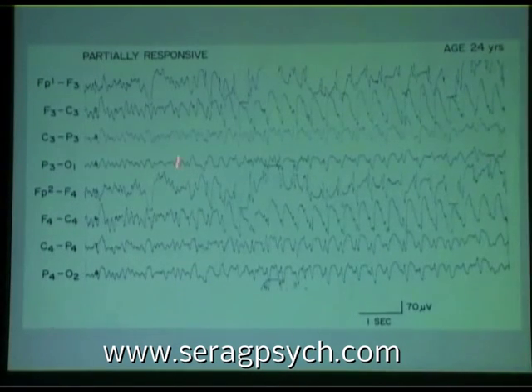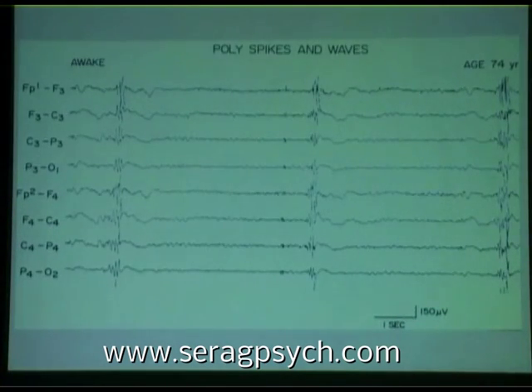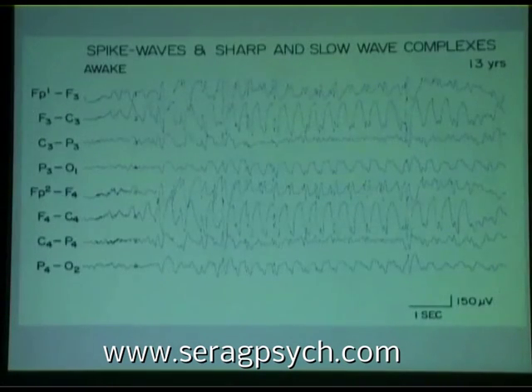And then as she gets a little bit more alert, she goes into spike wave discharges. So next, please. And well, I guess these are still polyspike discharges, aren't they? They almost look like artifact, don't they? But then there's that after-coming slow wave there. Next, please. And boy, these are terrible old slides. They're getting worse with time.